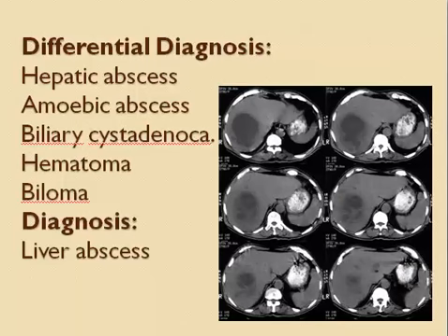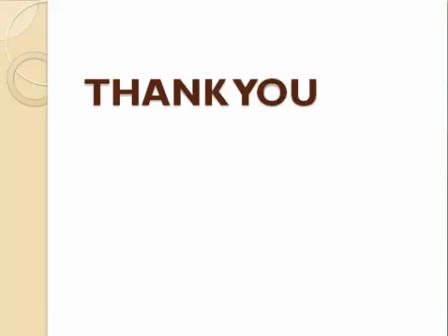Now what are these? We have multiple gathered-together cystic changes with ill-defined margins and ill-defined thick partitions in between, and this is the typical appearance of abscess formation. Thank you.